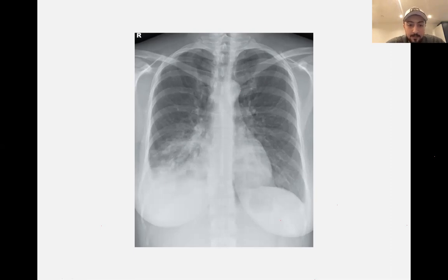Basically, that means that the consolidation or the white shadow has a diffuse pattern. Yani it's not patchy, there's no spaces in between, and it's not really well defined, it's diffuse. So it's also good to use this terminology: diffuse, well defined, widespread if it's covering the whole lung. Okay, you can see here, if you also look at the heart, it is not covering more than 50% of the cardiothoracic diameter, so it is fine.